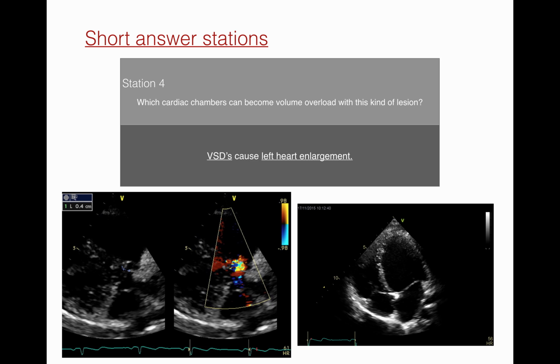Just like the images at the bottom of this slide, which are from a young girl with a perimembranous lesion, VSDs can cause dilatation of the left-sided cardiac chambers.